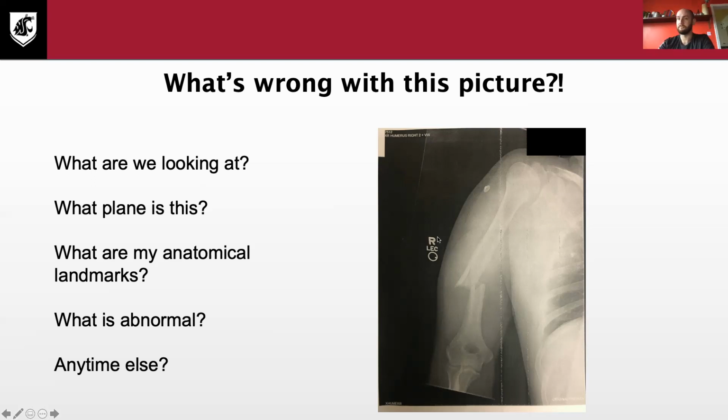And this is actually my arm from when I broke it. So this would be a mid-humeral comminuted fracture. We have 3 different pieces here. It's hard to tell. One thing with x-rays is that we always want to try and have a few different planes of imaging. So this would be what kind of image? Frontal, good. So we have a front half, back half.